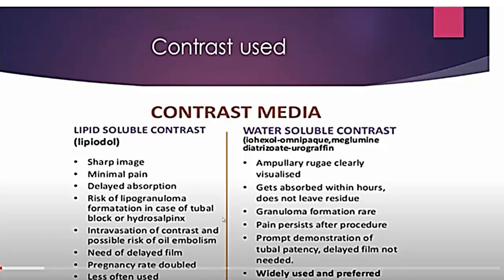So how do we differentiate between lipid-soluble contrast and water-soluble contrast? Lipid-soluble contrast shows a sharp image. However, the rugae and the ampullary rugae are more clearly visualized with the water-soluble contrast because it is not so dense. The lipid-soluble contrast causes minimal pain, while the water-soluble contrast gets absorbed within hours and does not leave any residue, and it is more painful. With the oil there is delayed absorption; here the absorption is within hours.